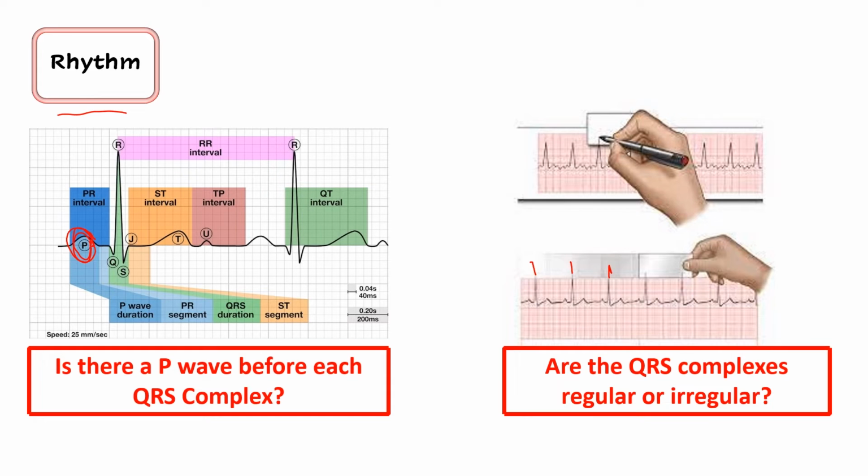And then you take your piece of paper and you march it down your 12 lead and see if there's any discrepancy between those QRS complexes, and if they move or if the beat becomes irregular, then you have an irregular heartbeat. And I would tell you, the faster the heart rate gets, the more subtle this gets to see. And so it really is a good practice if you're curious about the rate and if it's regular or irregular to do these hash marks on a separate sheet of paper and see if it marches out. And that'll tell you the regularity.